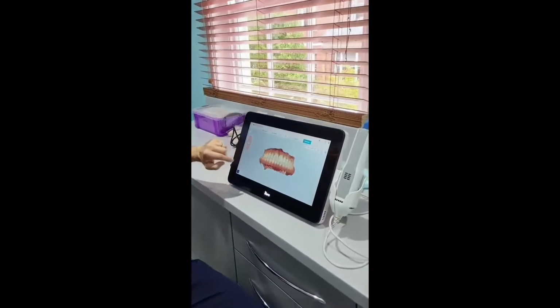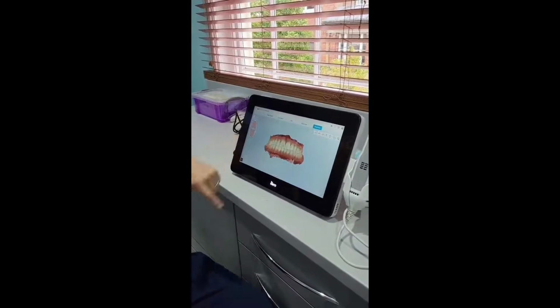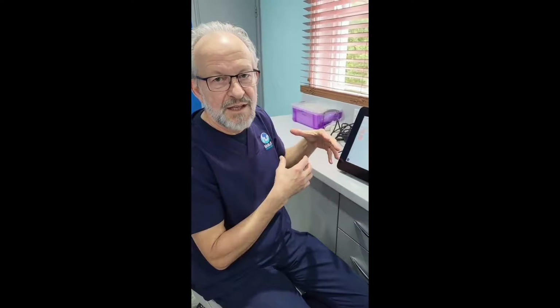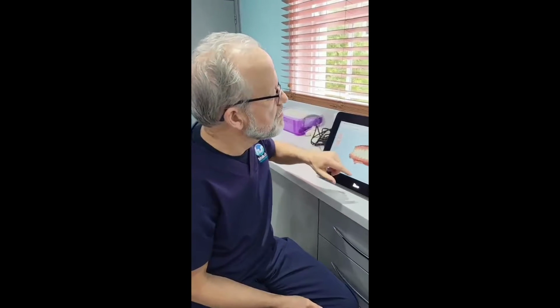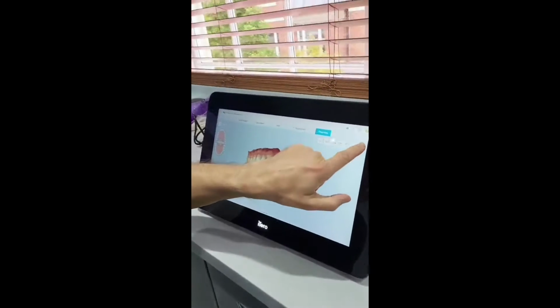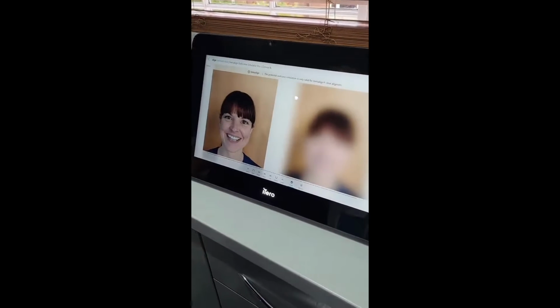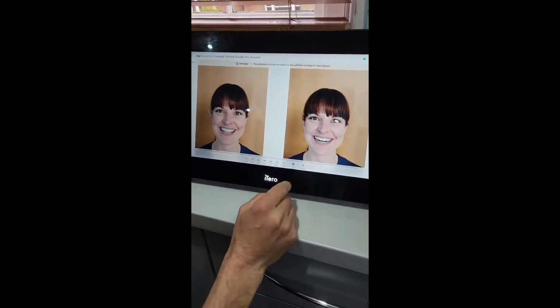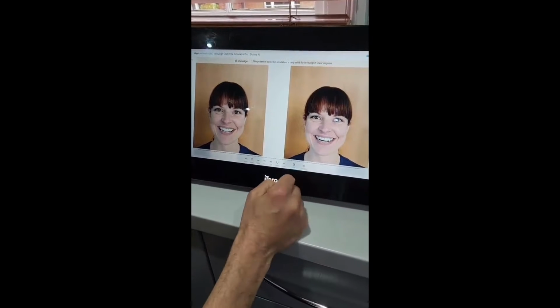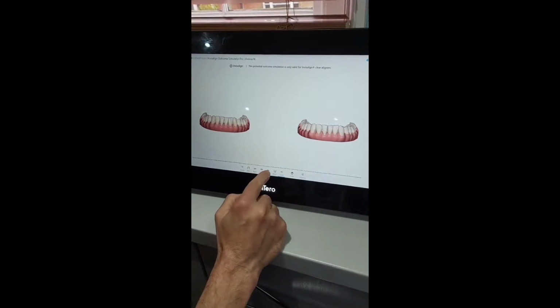And I think that's roughly it. There is also an ability to do an outcome simulator where the system will then straighten the teeth as well. So I do want to show you that one as well. That's that button there. Donna hates this picture, by the way, which is why I'm showing it. Yeah, great. So there you can see, if we straightened your teeth, Mrs. Jones, this is what they would look like, and that's what they'd look like there. You're probably all familiar with this already.